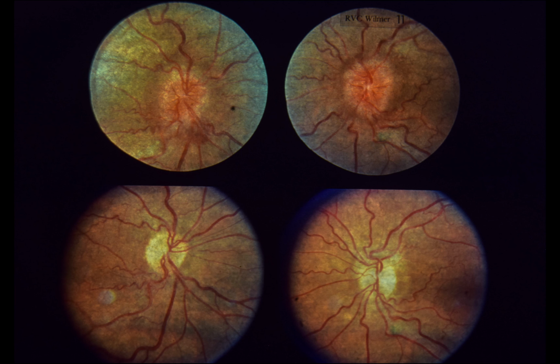The optic discs are edematous and hyperemic, and the retinal veins are dilated. There is a small hemorrhage inferior to the right disc. An MRI scan revealed small lateral ventricles, and lumbar puncture showed an elevated cerebrospinal fluid pressure. A diagnosis of pseudotumor cerebri was made, and the patient was started on systemic steroids and followed for 6 months. Visual acuity and fields remained normal, but papilledema persisted, and the patient began to complain of transient obscurations of vision.